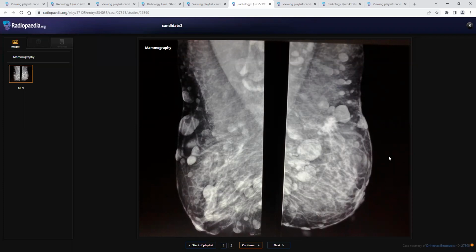There is adjacent spiculation, and I cannot see any amorphous calcification within the lesion. I would like to have magnified views of the lesion, and on the basis of this imaging, I will consider it as highly suspicious for a malignant lesion on the background of likely neurofibromatosis, and I will advise an ultrasound of the breast and refer to the breast clinic for ultrasound and examination of the breast, as well as refer for biopsy of the lesion.